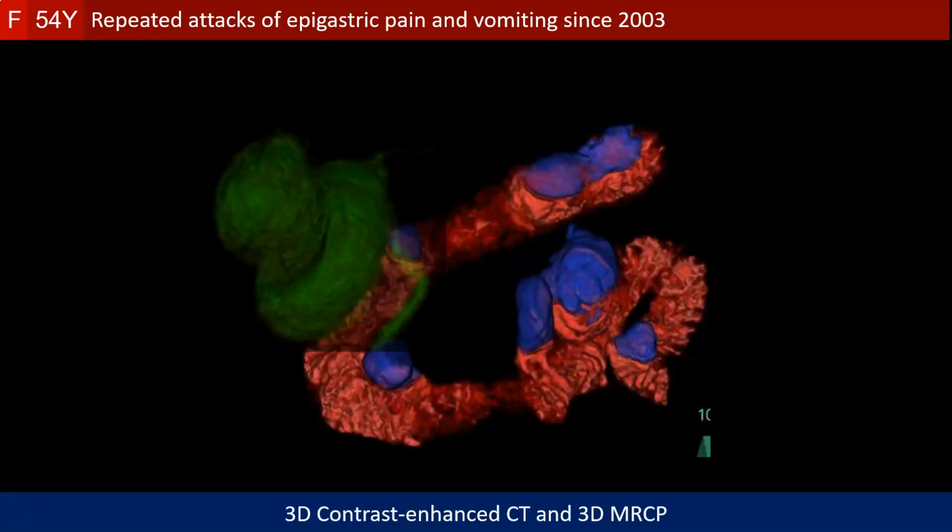So during the operation, the jejunal diverticulum, the one which has perforated, has also been removed, and this fused image of the CT showing the upper gastrointestinal tract and the MRCP showing the bile ducts and the gallbladder are fused together, and here you know why the gallbladder has been inflamed.